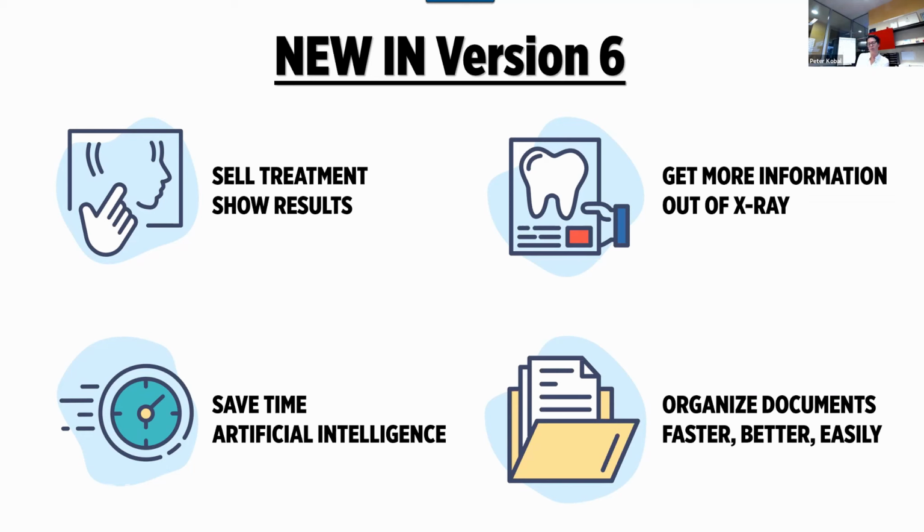And also, the last one, medical documents are valuable and important. AudaxCeph will help you find various treatment plans for your cases with the documents, and also it will keep all the media files such as images and their deliverables neatly stored on stages of treatment. These are all improvements that were made in the software, and it was all made for you to use more productively in your practice.